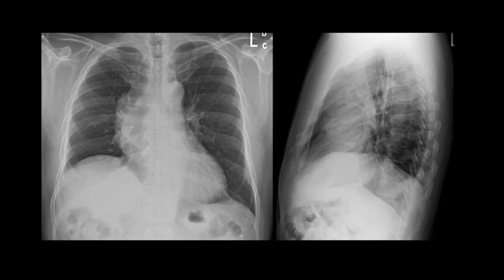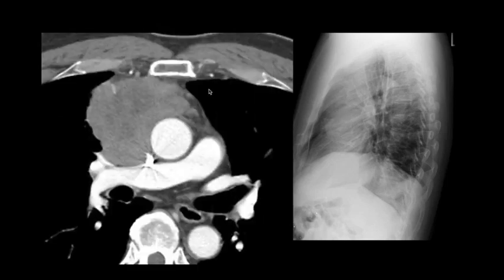Here's an example of an abnormal right mediastinal border in which there's convexity that projects over the hilar vessels. We can see on the lateral radiograph we fail to see the ascending aorta, and that's because there's a soft tissue mass interposed between the ascending aorta and chest wall, a mass that obliterates the normal right mediastinal contours on the frontal radiograph.